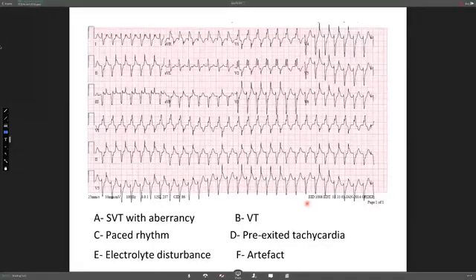Any comments, Fathi? No, I have none. As I said earlier, sometimes the machine, like Yousef said, adds those to make it clearer, but sometimes it's confused. I don't understand the mechanism by which the machine decides to put some spikes. It may confuse the picture a little bit. I have a couple of comments on it.